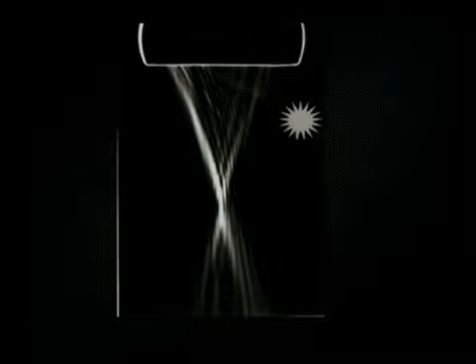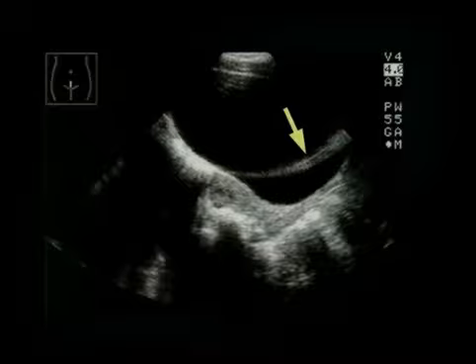If, for example, a strong reflector, such as gas or bone, lies outside the primary beam and encounters a side lobe of high energy from the transducer, the echo from that interface may return to the transducer. The machine assumes that the echo is coming from along the beam path and therefore displays the echo in an incorrect location within the image. These are called side lobe artifacts and may be quite conspicuous.